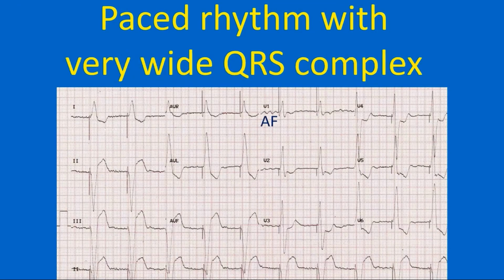12-lead ECG showing paced rhythm with a very wide QRS and atrial fibrillation. ECG shows a paced rhythm with a wide QRS of 200 millisecond width. A prominent pacing spike is seen before each QRS complex, indicating a ventricular paced rhythm with complete capture. Coarse atrial fibrillary waves are seen in leads V1 and V2. Hence, the underlying rhythm at present is atrial fibrillation.